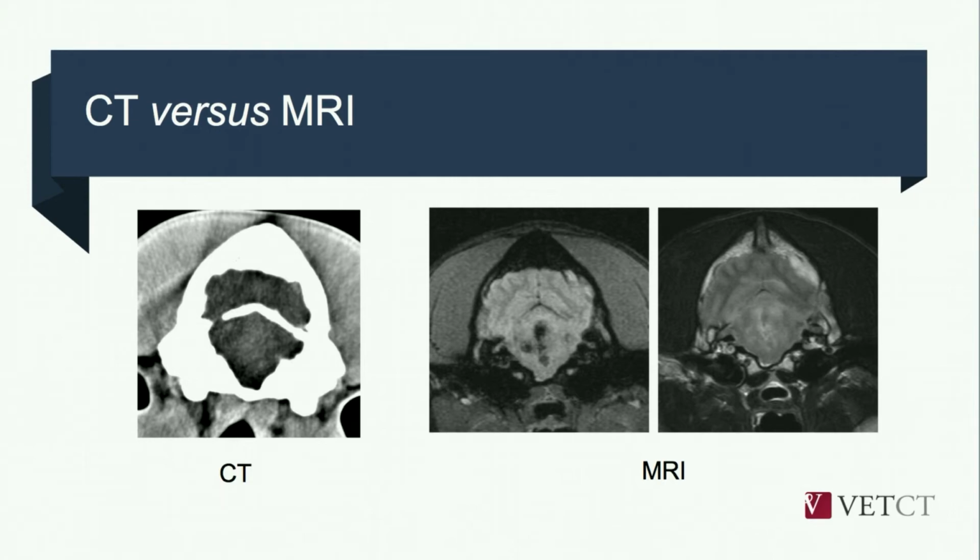And really, if given the choice, when it comes to intracranial disease, MRI is usually going to be better. And we can see a nice example here of a dog which has a parenchymal bleed within its cerebellum. We see it very nicely on the MRI, but the lesion is not visible at all on the CT. So, MRI for the majority of cases. The MRI was done on this case, and we'll look at those imaging findings now.